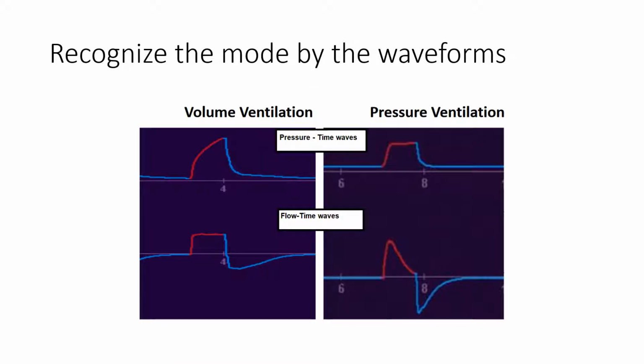Okay, this lesson is going to go over recognition of waveforms and troubleshooting. I'm going to assume you all have the basics down. If not, some things you're going to want to make sure you can do is identify the mode of ventilation the patient is in when at the bedside and looking at your waveforms on the screen.